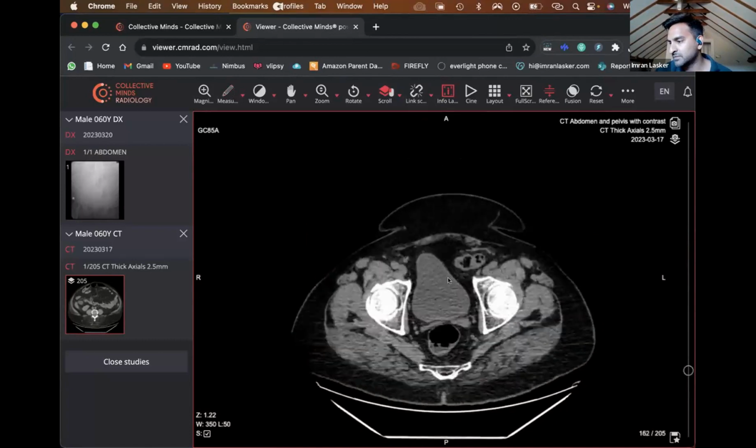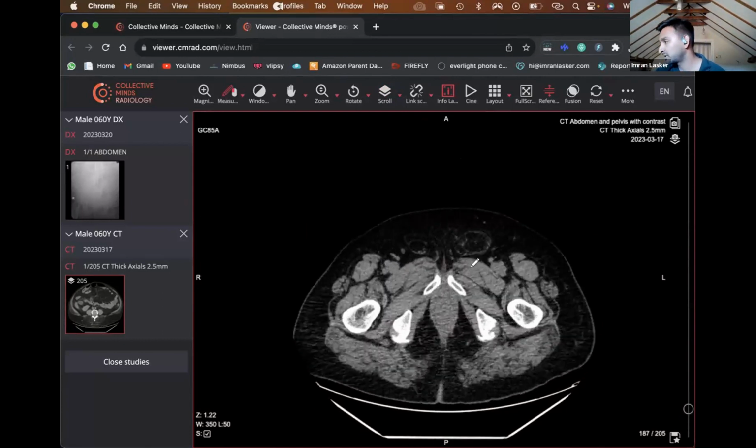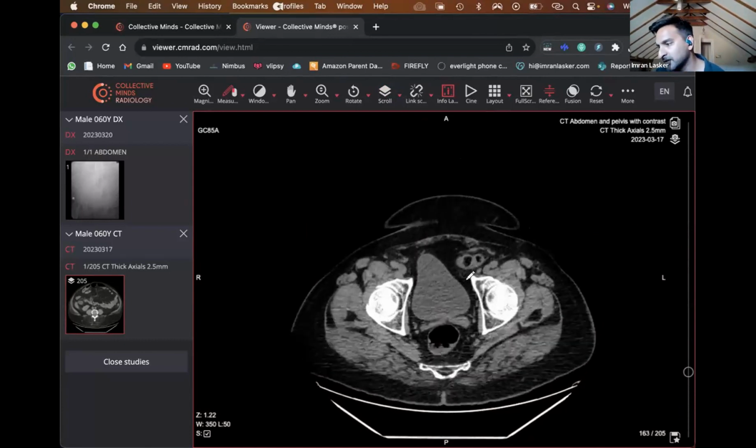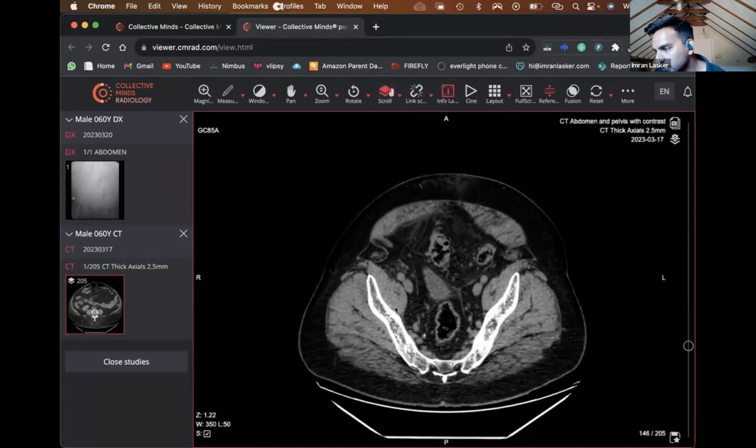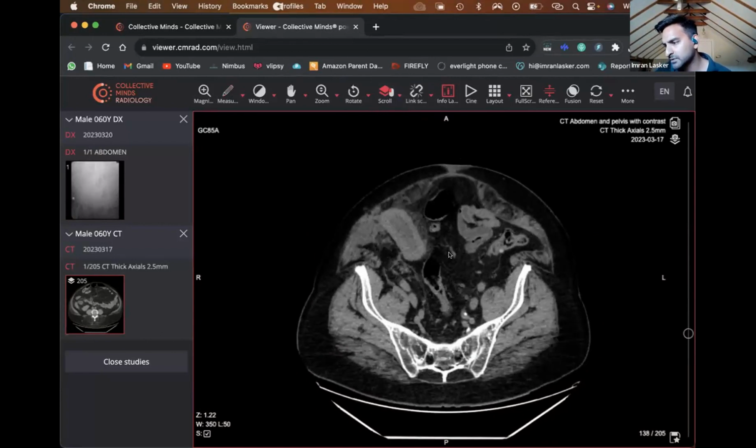All right, so then we come down to the bowel, and you can actually see here and here. Let's draw that here. Over here and here, you can see these circular fatty areas. So they've got inguinal hernias, but we can't see any evidence of any herniated bowel anywhere. Now what we'll do is follow from the rectum, going all the way up.